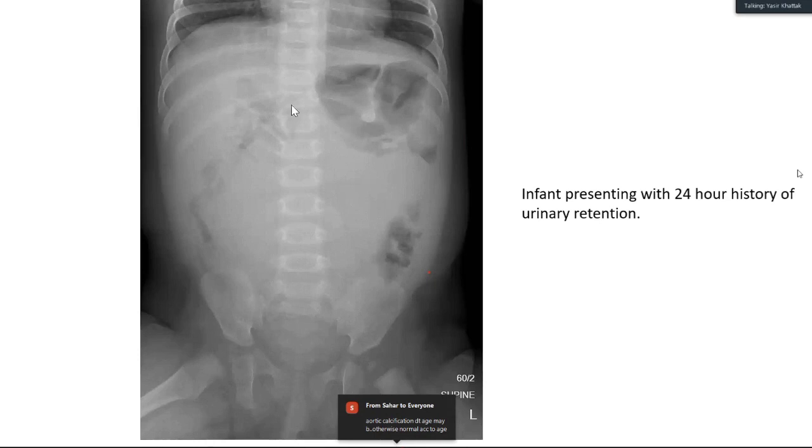Right. In this particular case, you said this is an infant or an immature patient. You see an opacity. Why, ask yourself, why is this a soft tissue opacity? This is a soft tissue opacity because the anatomy looks disturbed. Why is it so? You see, this is a lucent line, which is the shadow of the psoas muscle, right? Okay, this lucency is the fat which is seen adjacent to the psoas. You don't see it on this side.